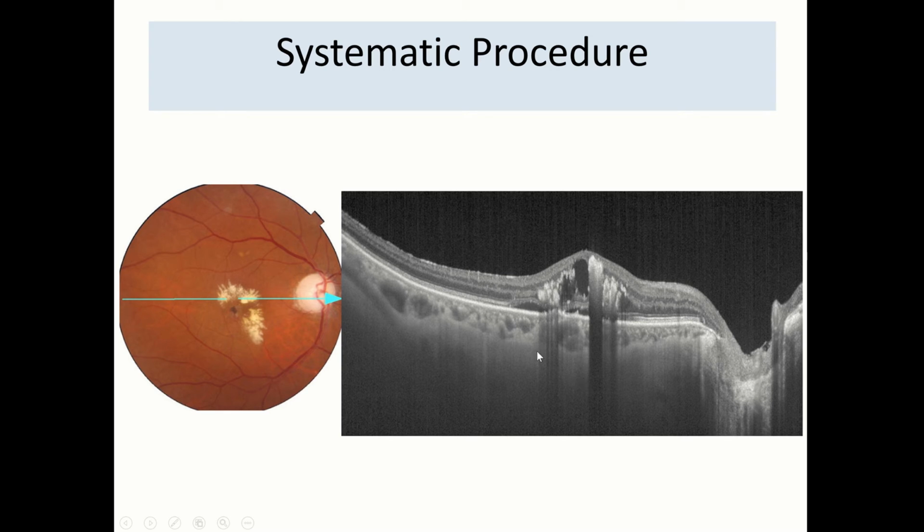So this was a patient in which the next thing you wanted to see is the retinal pigment epithelium. It seems to be elevated, and there seems to be slight irregularity in this area. And the other important thing, this is the external limiting membrane running over here, which seems to be slightly disrupted in the center, and then the ellipsoid layer is totally absent in this area.